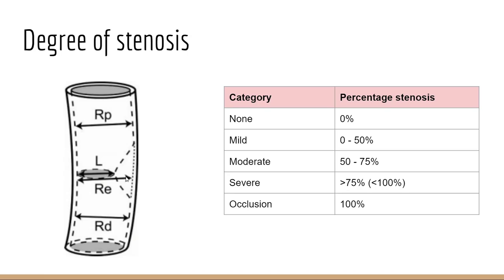Personally, I go by the lesion, where the lesion is itself in terms of determining my stenosis. So I'll find the diameter at the lesion and then the reference diameter at the lesion from wall to wall, and come up with a degree of stenosis or percentage of stenosis based on those levels. But do it whatever you're comfortable with and whatever you're used to. I just find it easier with our software to do it at the level of the lesion, because it's hard to get an automatic measurement in terms of ratios at two different levels with our PAC system. And I don't want to bust out a calculator or actually do math. I haven't done that in a while.